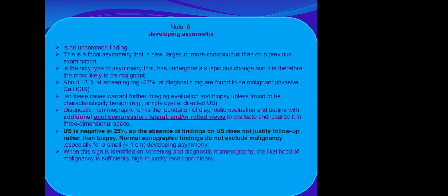When the sign is identified on screening or diagnostic mammography, the likelihood of malignancy is sufficiently high to justify recall for further evaluation and biopsy.